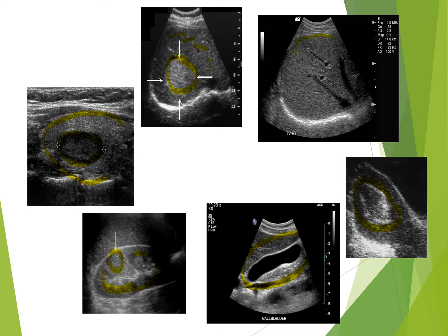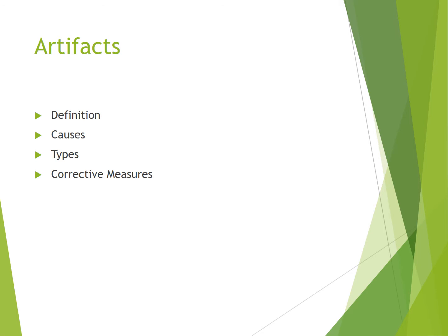And then looking at the liver parenchyma throughout here, it's very smooth, all the same level gray. We consider that homogeneous. So it's important to use these words to describe our findings, as we are not allowed to diagnose an ultrasound, but using these descriptor words will help the radiologist to understand kind of what we're getting at.